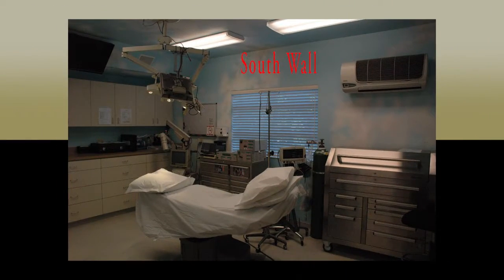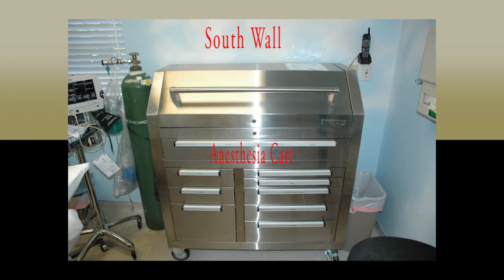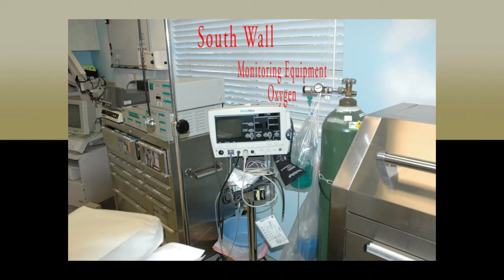The wall facing the door as you enter houses the anesthesia cart. This is the south wall. It is a metal toolbox that houses all medications and equipment used by the anesthesiologist. Adjacent to this cart, on the left, is the monitoring equipment that is used to monitor the vital signs, as well as oxygen tank and masks for the patient. This equipment will be used only by the anesthesiologist, and you will be in charge of cleaning them only.